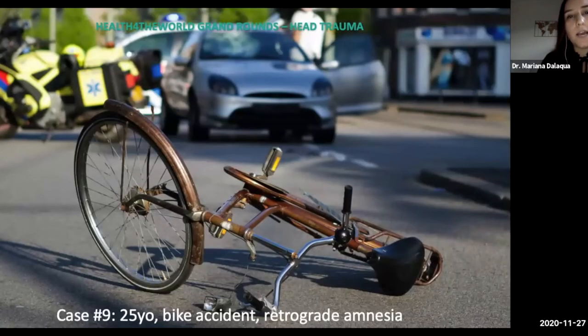So case number 9, we have 12. I'm almost ending. So case number 9 is about a 25-year-old female patient that had a bike accident with retrograde amnesia.